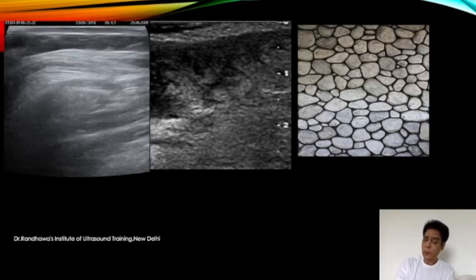One important thing is clinical. We all know that wherever there is cellulitis, it will be having overlying skin, which is red. Overlying temperature may also be increased. And on ultrasound, what you can make out is, number one, the skin. You can see the dermis part, which is next to the subcutaneous tissue.